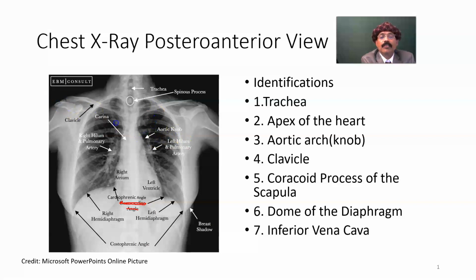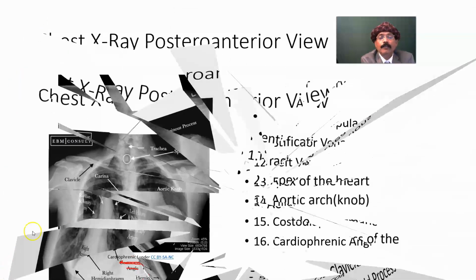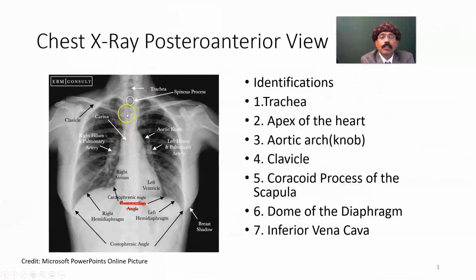In some chest X-rays, you may get some equipment like an endotracheal tube inside the trachea. Okay, endotracheal tube here. There may be a venous channel. In some chest X-rays you will get that. Some persons may be scoliotic or kyphotic, so the vertebra may not always be in the midline. Okay, we got that.